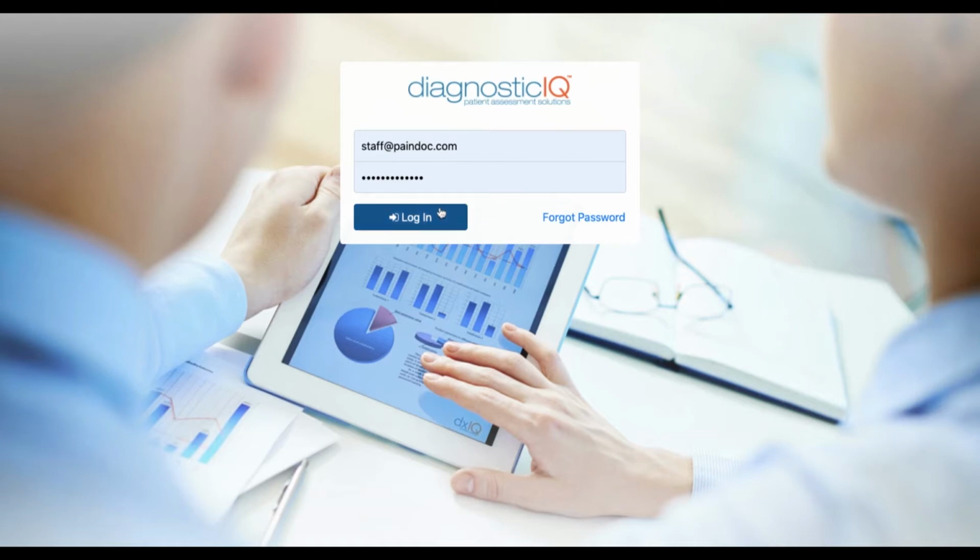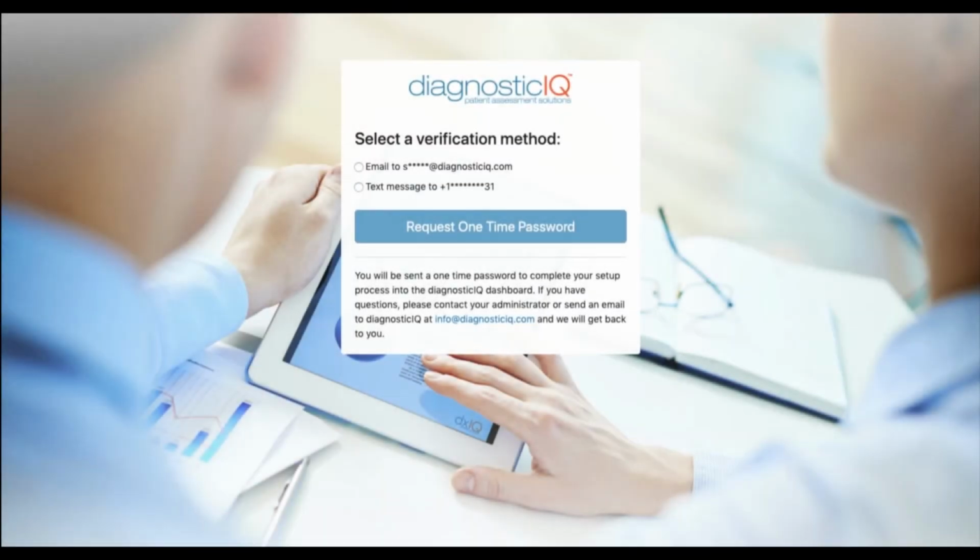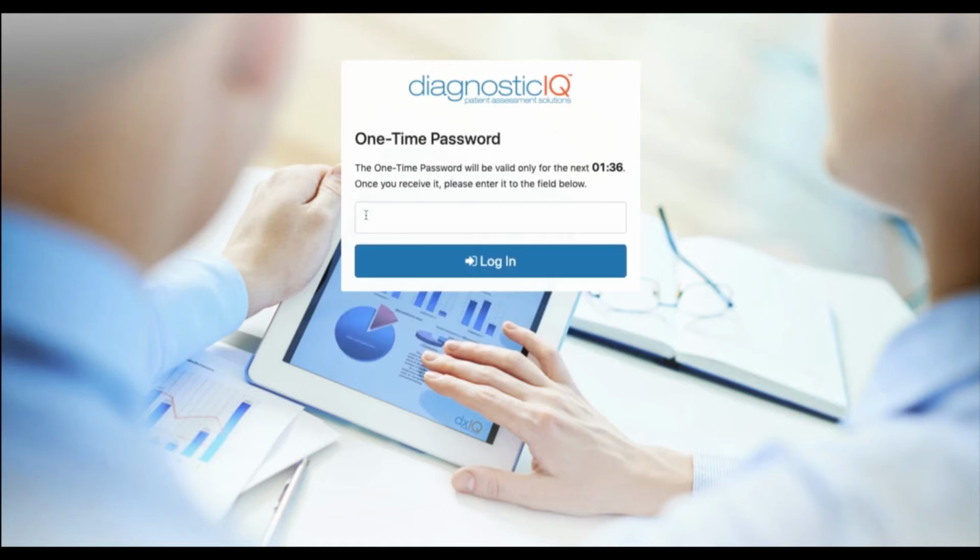HIPAA requires us to double authenticate and verify your credentials. You will be prompted to either select your email address or mobile number in order to receive a one-time 4-digit code. Select one and click the blue Request One-Time Password button. When you enter your 4-digit verification code, you will click the blue Login button to get your clinic's account and your personal dashboard.